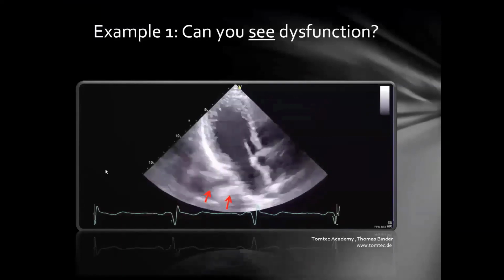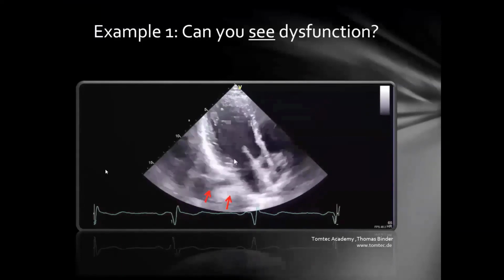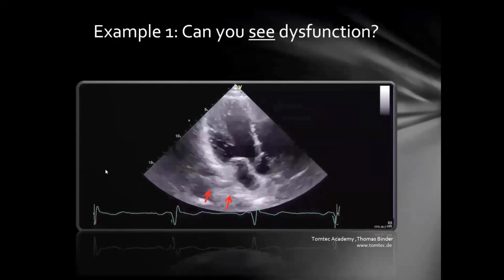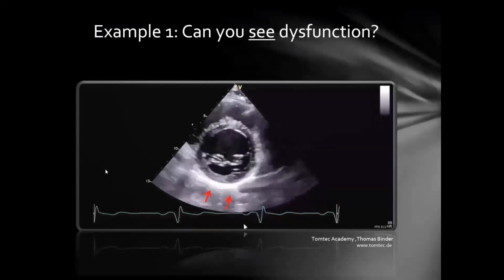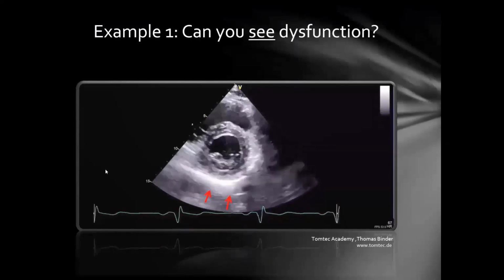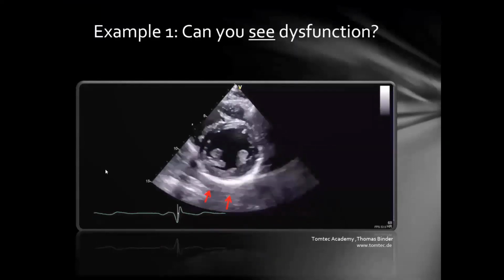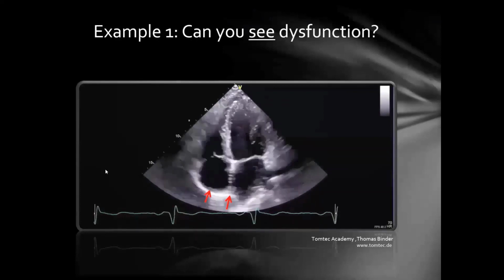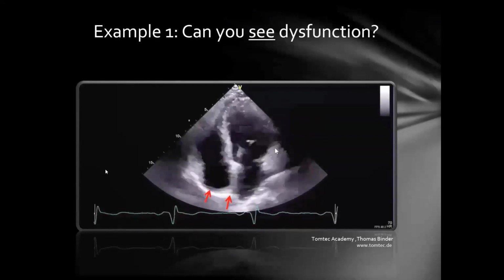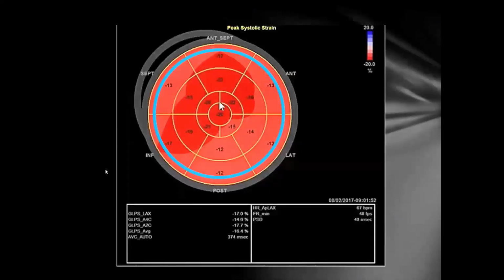And I put my arrows on there. And again, the posterior lateral part of the pericardium, I think is markedly notable as far as the thickening there. So if you did an M mode or all those kinds of things, you could do that. But again, if you were talking about a COVID-19 patient, you don't want to sit there and do a bunch of redundant imaging that really isn't going to add to what they need.